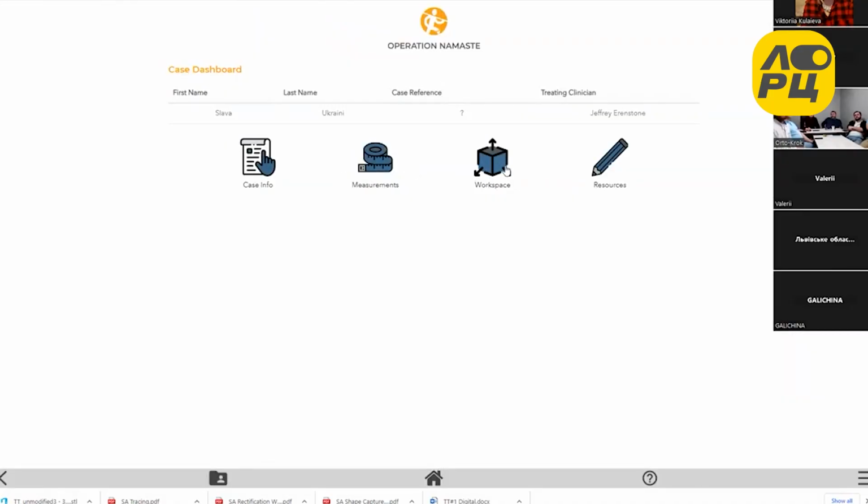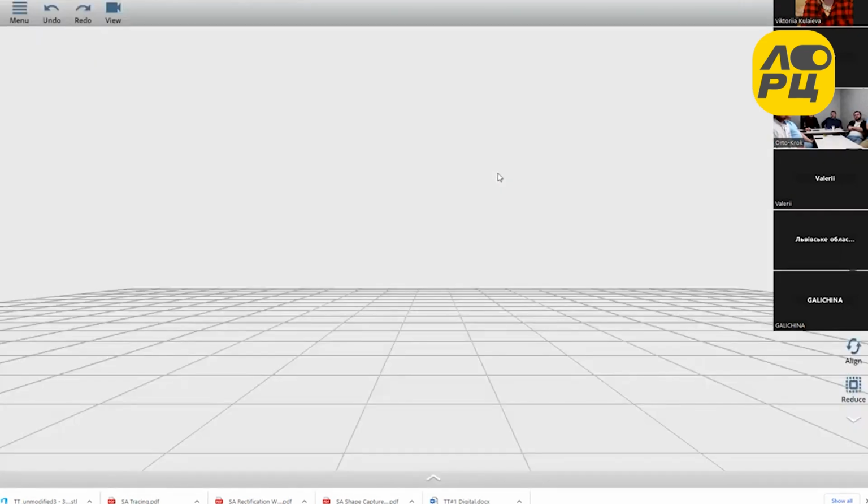Now the next thing is to go to the workspace. And so this is the blank screen of the workspace.